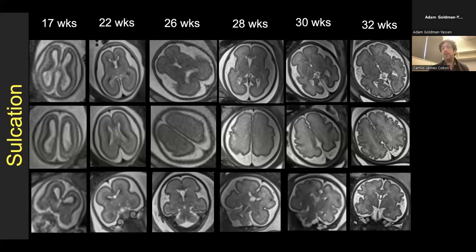So getting back to our sequence of sulcation, realize that if you image in the early or middle second trimester, so before 17, the brain is still fairly smooth. So you will have your interhemispheric fissure, but realize that you actually have to struggle to find the indentation for the Sylvian fissure, very early, for the Sylvian fissure to be seen before 18 weeks.